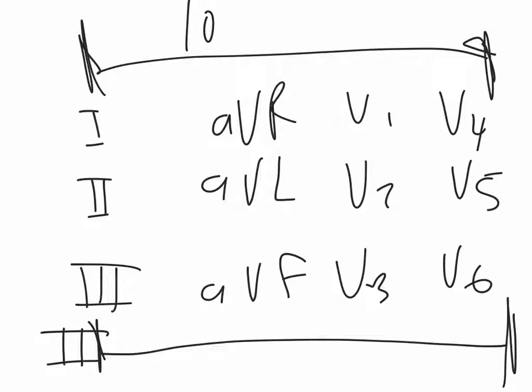And so while the math isn't quite as easy as doing a 6-second strip and multiplying by 10, you can do the whole 10 seconds and multiply by 6. And the advantage is you get slightly more accuracy as well. So the longer the seconds, the more accuracy you get. If you did 60 seconds, you'd be perfectly accurate, right?